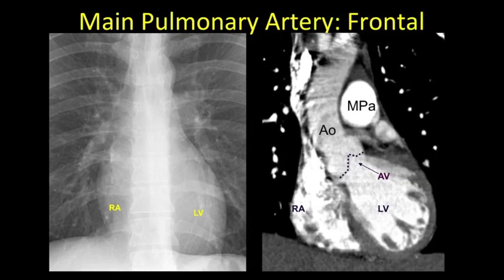So now on to the main pulmonary artery, which is inferior to the AP window. The main PA is convex to the lung or concave to the mediastinum, and as we can see here is the border forming structure on the frontal radiograph. The pulmonary arteries on the left can be seen emanating from this main pulmonary artery structure.